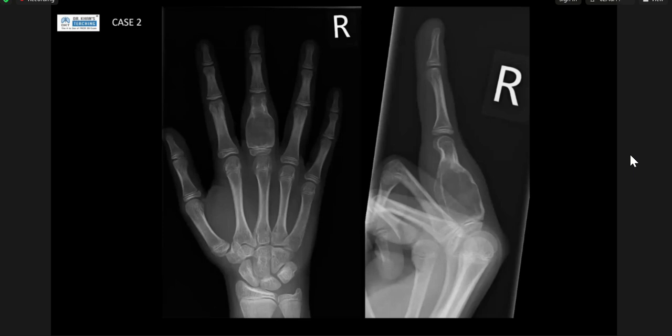Yeah, a cross-sectional MR, to comment upon its aggressiveness and further involvement of other structures. Okay. So I would agree doing an MR would be helpful if the patient were having symptoms. Enchondromas are fairly common. I wouldn't suggest doing an MR for every enchondroma that you see. But that was really well presented, really nice.